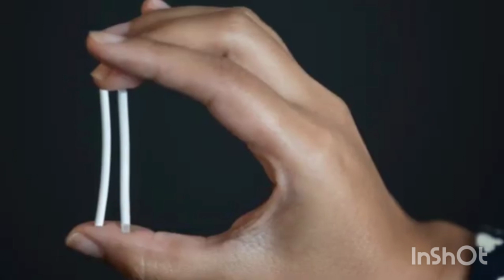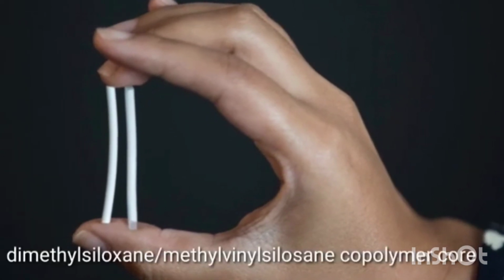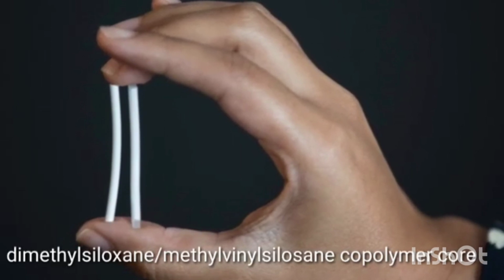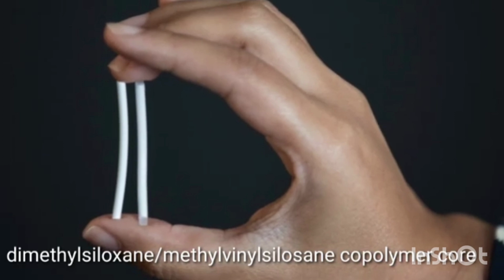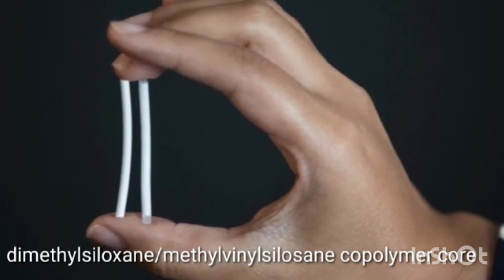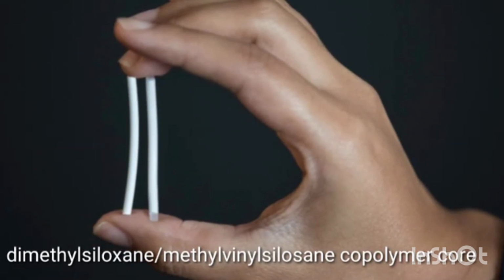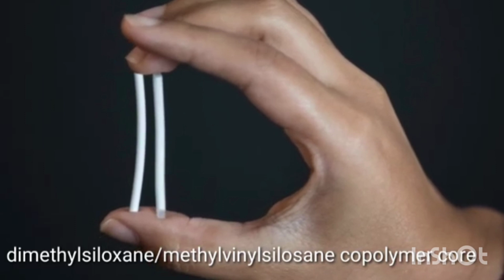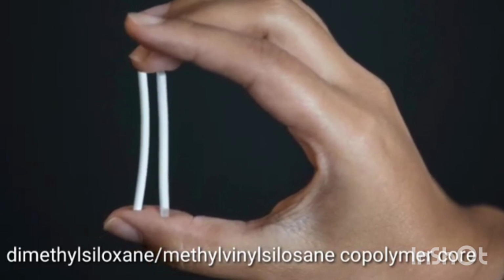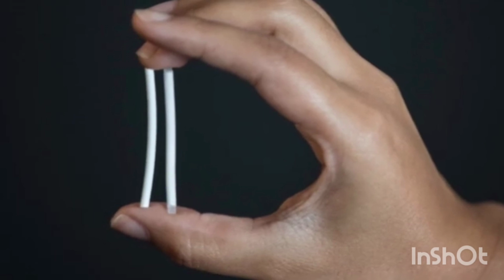Jadelle, levonorgestrel implants, is a set of two flexible cylindrical implants consisting of a dimethylsiloxane-methylvinylsiloxane copolymer core enclosed in thin-walled silicone tubing. Each implant contains 75 mg of the progestin levonorgestrel. The implants are sealed with polydimethylsiloxane adhesive and sterilized. Each implant is approximately 2.5 mm in diameter and 43 mm in length.